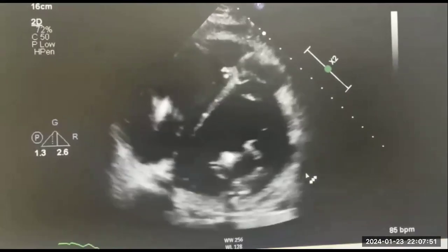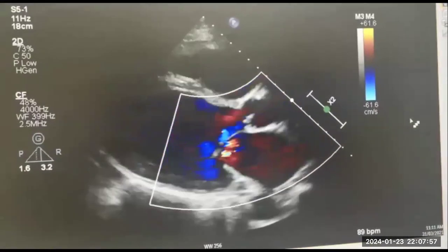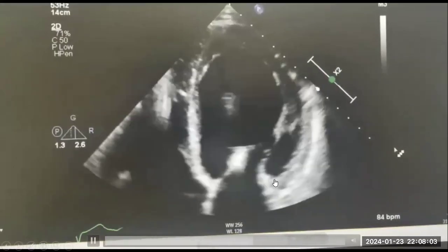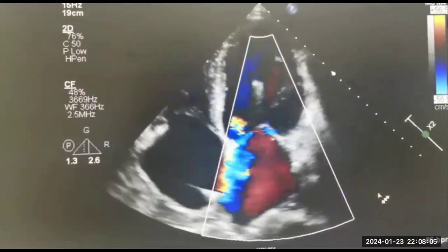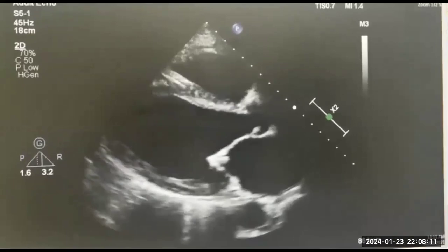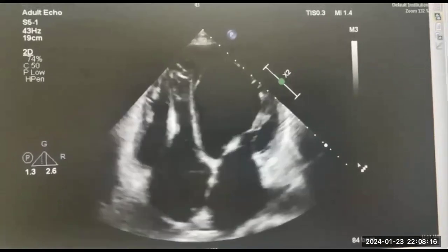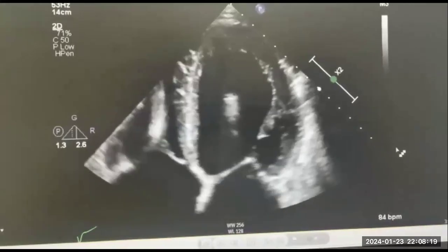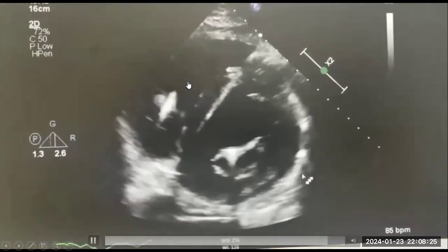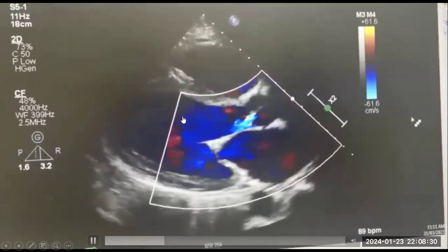I need you just to code as per the coding sheet, please. Go ahead, Dr. Aziz. You have a lot of findings. You mentioned it: severe LV dysfunction, severe reduction in the ejection fraction, severe global hypokinesia. There is also aortic regurg. You have dilated both atria. And if you want, there is an RV lead. This is one of the codes. You have LA dilatation, and the LV is dilated also.